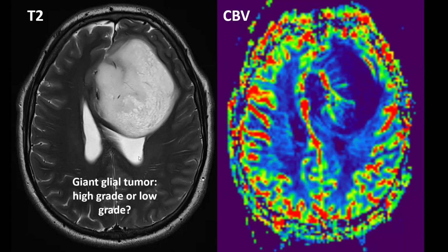This was also a glial tumor. This was a diffuse astrocytoma, and it looks very big, it looks a bit ugly. Simply based on the size of the thing, our gut feeling says, oh my god, let's hope this is not malignant. Now, WHO grade 2 tumors are not innocent either, but if you can choose between WHO 4 or WHO 2, I'd still pick the 2, of course. Well, if we do an MRI perfusion, we see no hyperperfusion in this mass whatsoever.